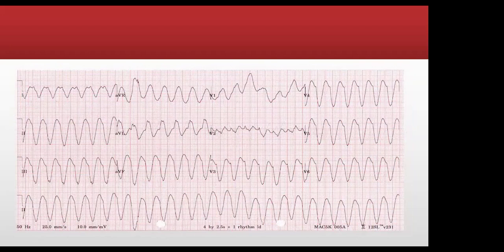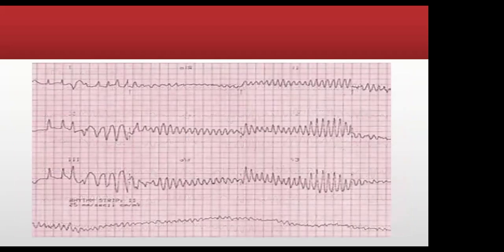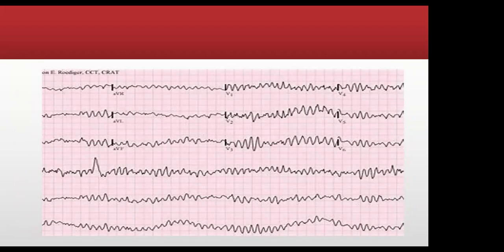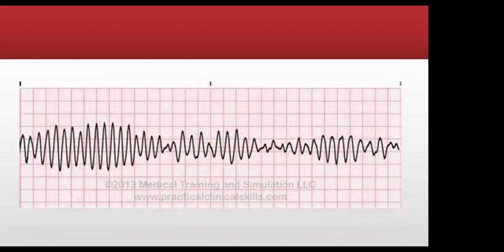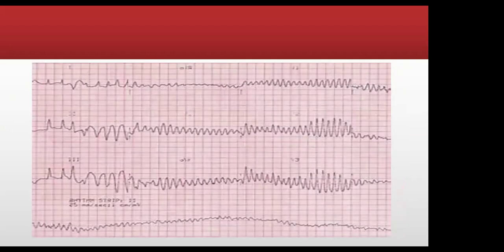So, similar stuff, just to remind us. What do you think this is? Okay, how do you differentiate it from this? Look at this one, and this one, and this.